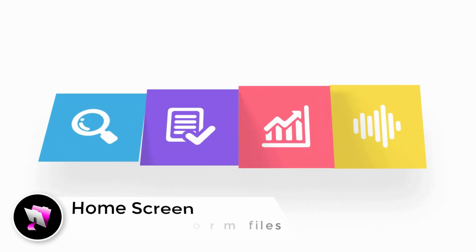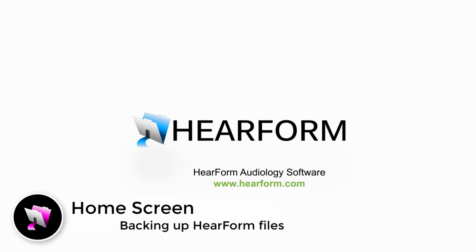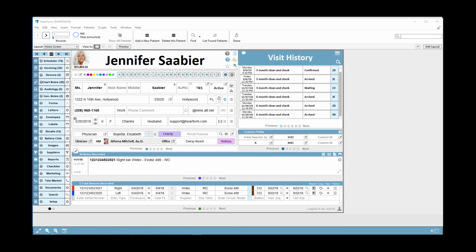Welcome back. This video will discuss the topic of backing up your HearForm files. Backing up HearForm is one of the most important things that you can do with your data file.